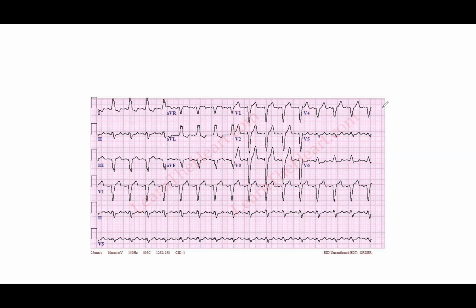All right, so asking ourselves some questions, finding out what the rhythm is, right? P waves present, upright, P for every QRS, P same morphology, cool. PR intervals, looking good, going all the way across, right? QRS width, we got something abnormal here, right? We got some wide QRSs wherever you want to look. They're wide everywhere, right? Okay, we'll come back to that.